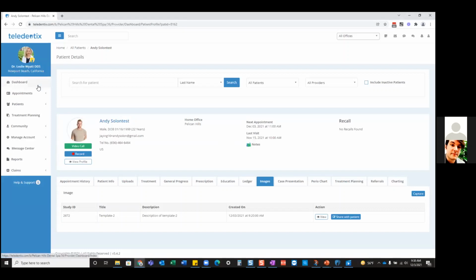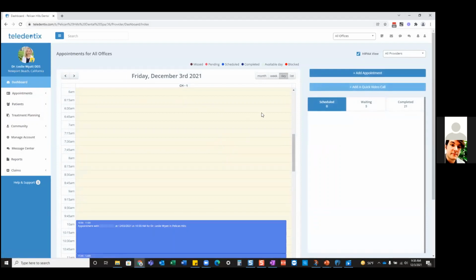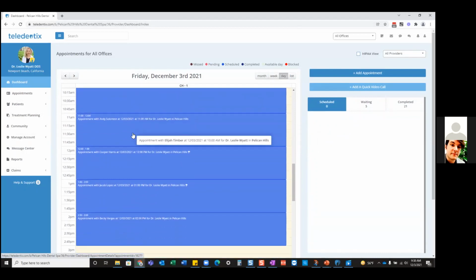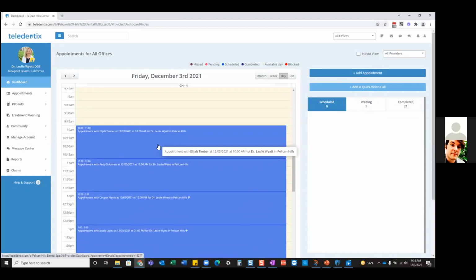All right, guys. Let's go ahead and start off. I'm going to head over to my dashboard. As you know, the dashboard is the place I go to every single day to see what my schedule looks like. What's in store for me today? It looks like I'm going to Pelican Hills office, and I have appointments from 10 a.m. up until 3, a total of 5 patients lined up back to back.